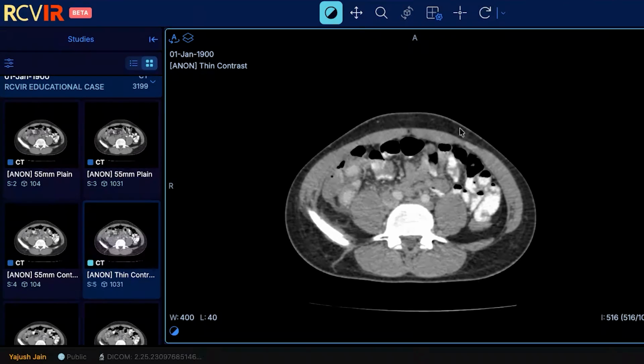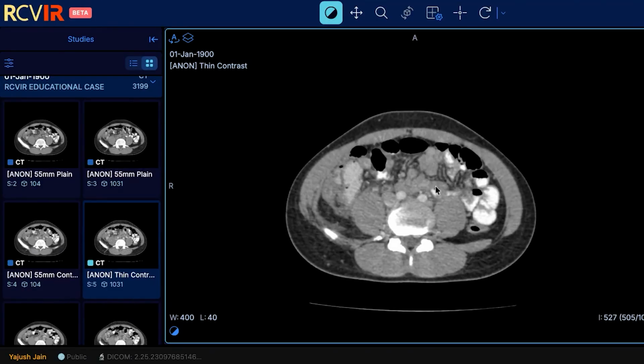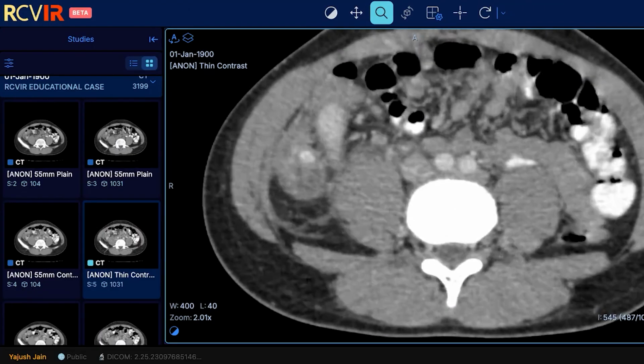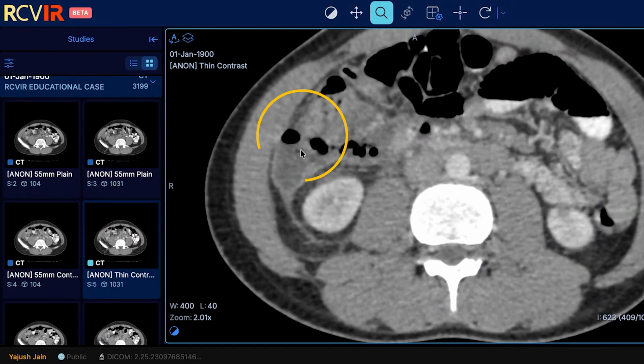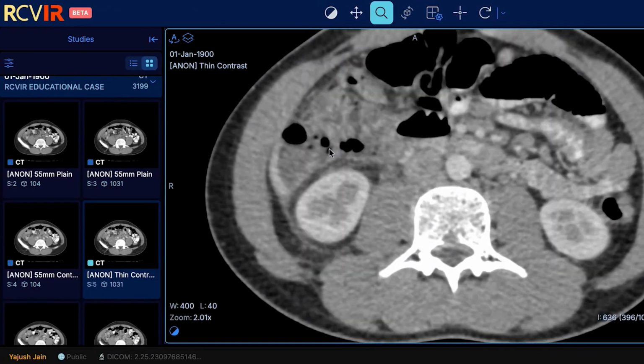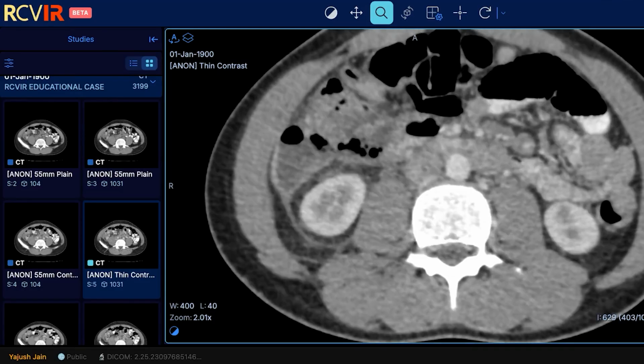Okay, so let's take it back to the abdominal window. Can you see these micro air pockets here, like this? These are not surrounded by the bowel loop, and as we go up here we can see this free air which is totally present in the peritoneum. So now why is this important? Because the patient had sudden relief of the pain. That means the perforation of the appendix has occurred.